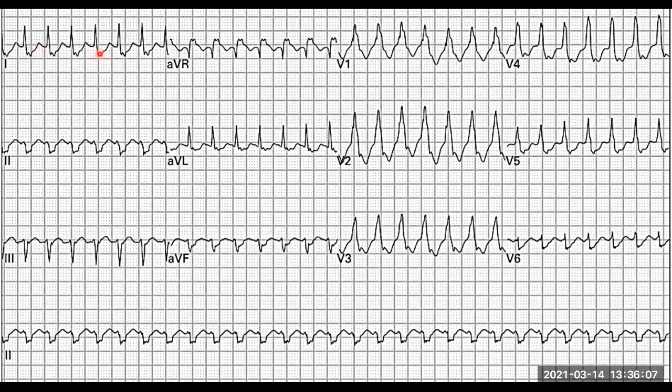Is that a P wave? Is that a T wave? What is that little notch over there? So you understand where the difficulty comes about. Now, we're going to get to the answer just now, so we'll know how far we were, how close we were. And if we look at this, then we can see the septum, the anterior part, as we get towards the lateral border. But mainly here we see where the ventricular tachycardia is mainly taking place. But let's go through each zone.